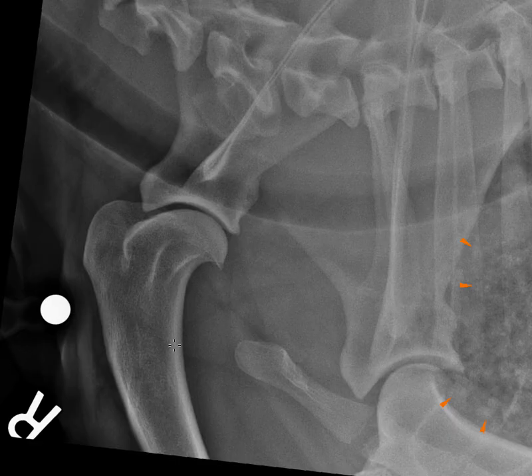So in this case, where I would land is that we have shoulder arthritis of the right shoulder. In a 10-year-old lab, this is not unexpected, and in fact, it may not relate to the patient's current lameness. Correlation with the orthopedic examination would be necessary.